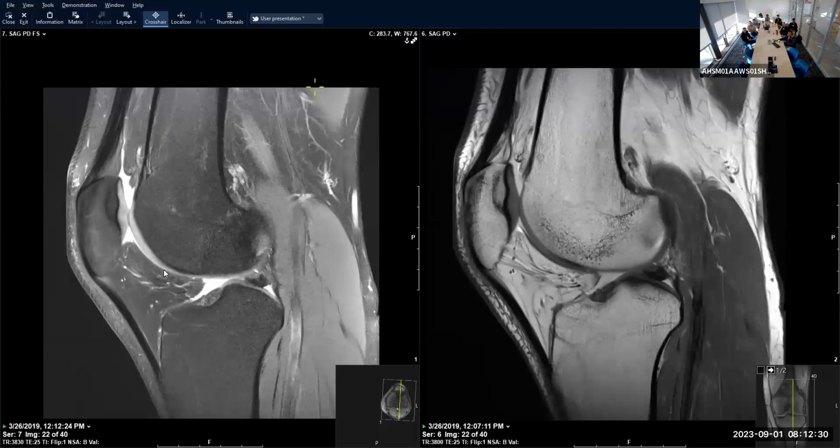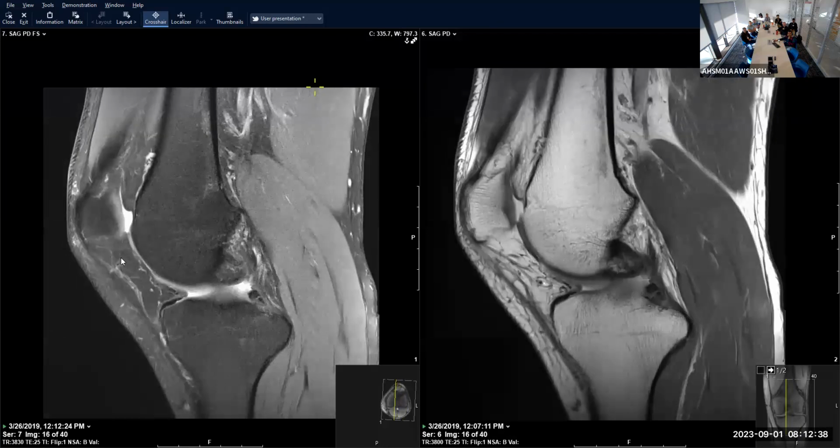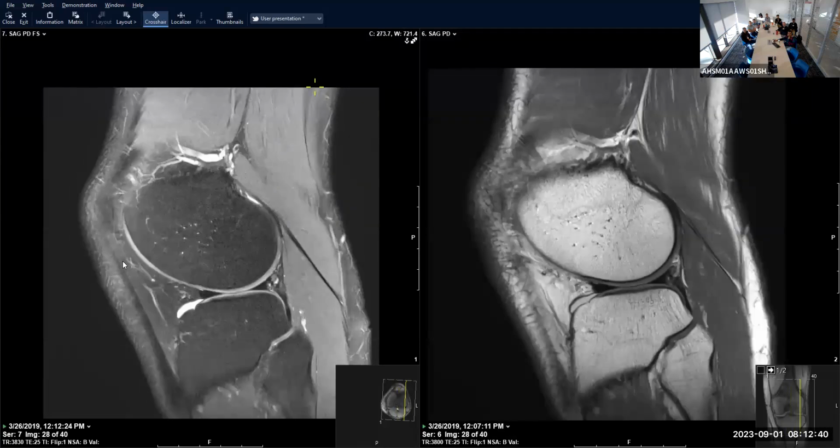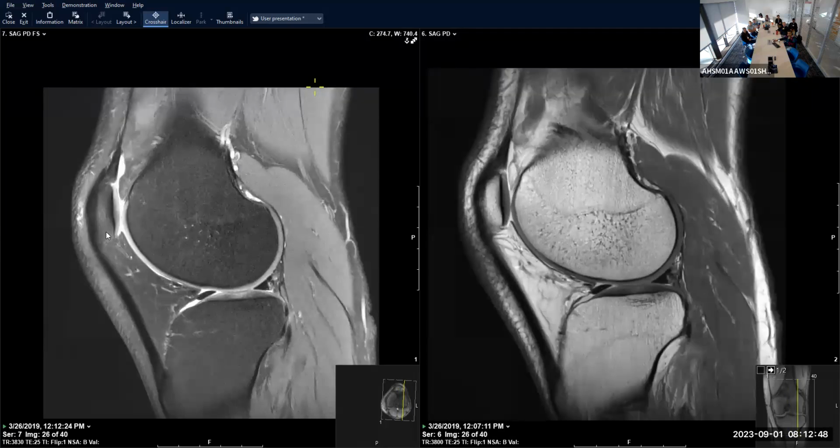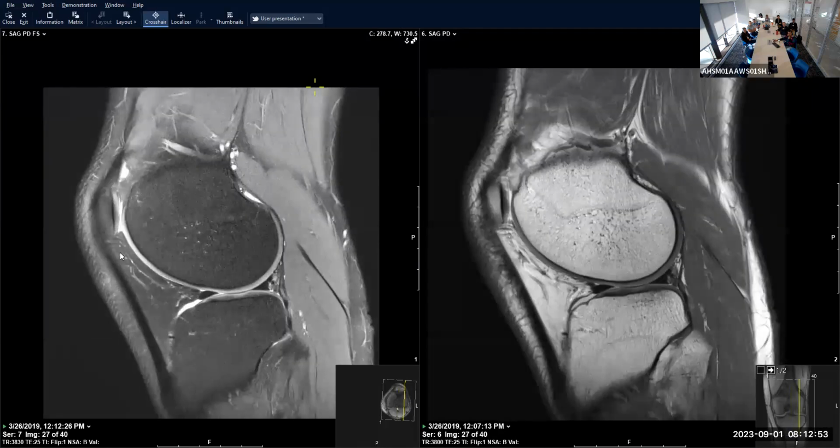That's the name for this triangular-ish fat pad deep and inferior to the patella. In the superolateral aspect, if we go lateral, we start to see the fibula. Sometimes you're going to see some soft tissue swelling here, some edema. On a T2 or PD, when the fat is suppressed, edema is bright. So we're looking for infiltration of this fat by bright signal intensity. It's not present in this case, but that's indicative of patellofemoral impingement or maltracking.